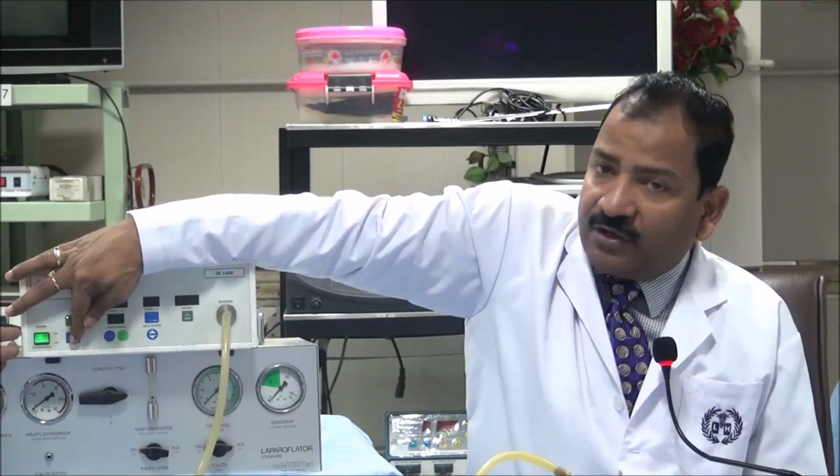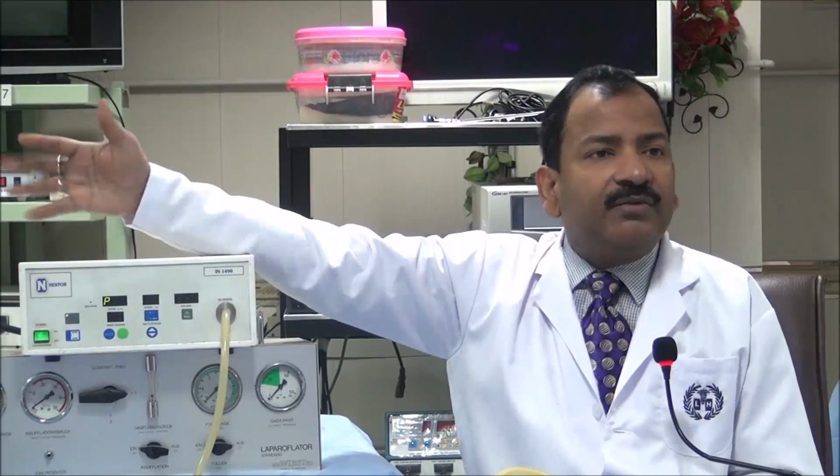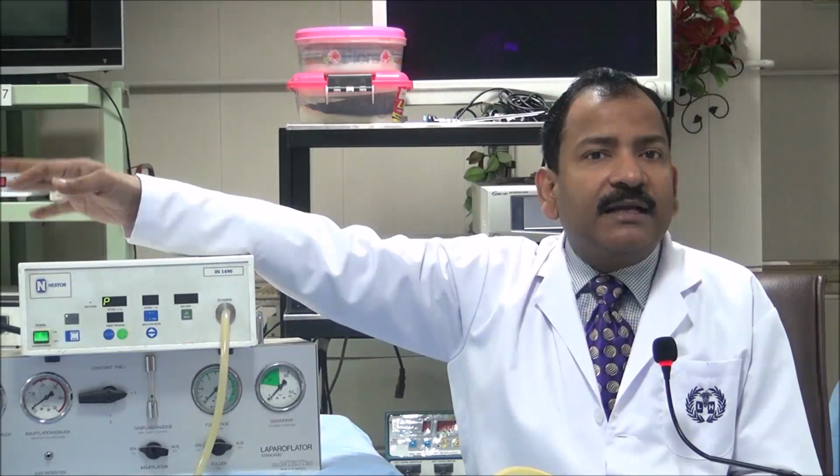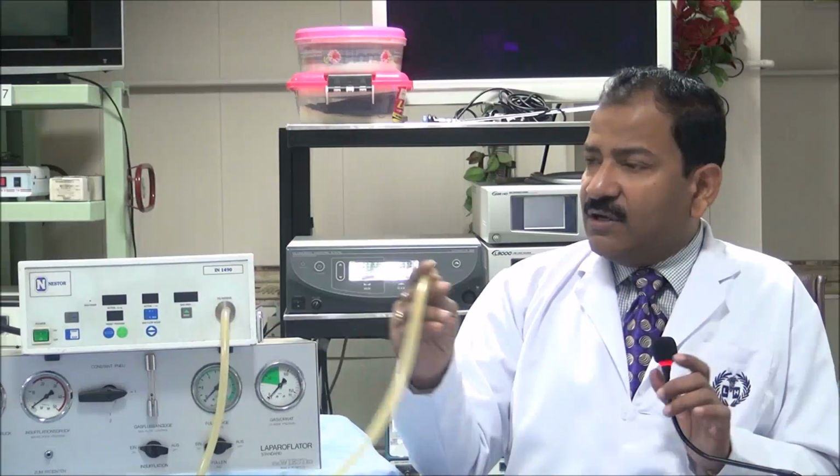Now it will not switch on. If you press the switch on/off, it will stay locked. So this is the microprocessor inside, which will automatically recognize the wrong steps.